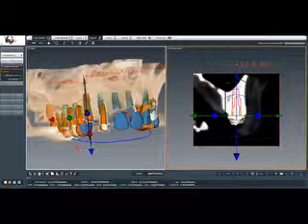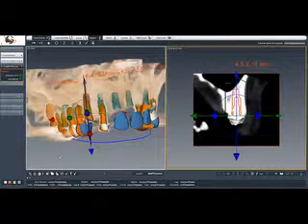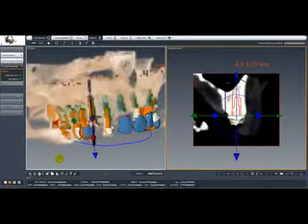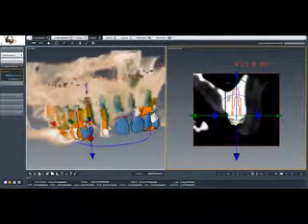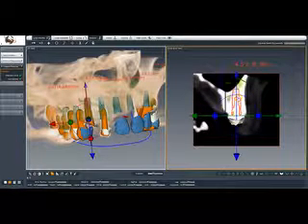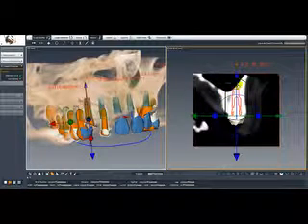So the next implant will be on tooth number 6 right there, right on the canine, and I'm going to do the same thing. I'm going to try to put it a little bit more palatal so we can engage some native bone, and I'm going to go ahead and propose here in the 2D view a 4.3 by 13 millimeter. We're basically going to be encroaching into the sinus area in there, but that last 1/3 of this implant is going to engage in native bone. So that will be a 4.3 by 13 millimeters again.